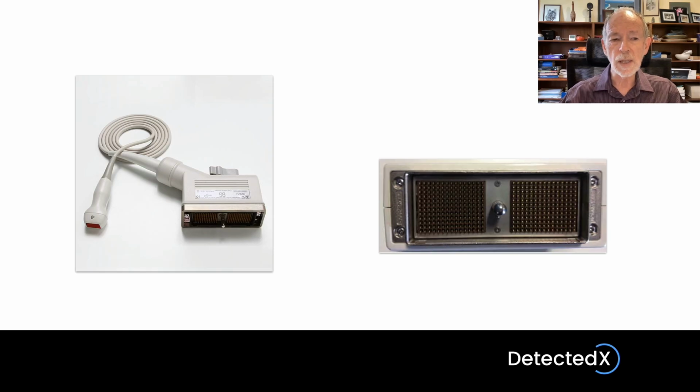The cables connecting the probe to this connector are shielded cables, which means every one of the 128 cables has a central conductor and then insulation, and then has a metal sheath around it to shield it from electrical interference, and then another insulating layer. So they're very similar, in fact, to the cables that cable TV comes on, or the sort of thing that you connect to your television antenna.